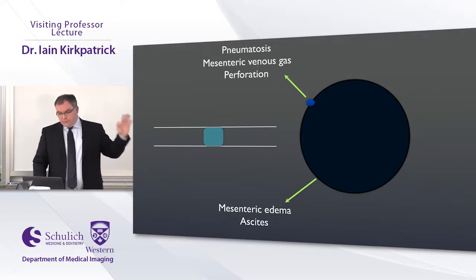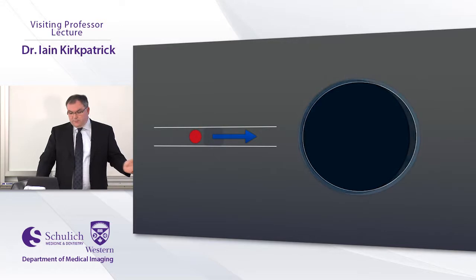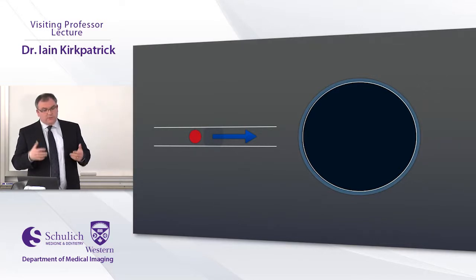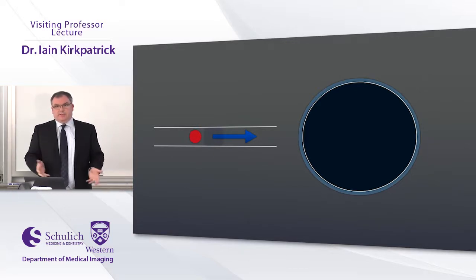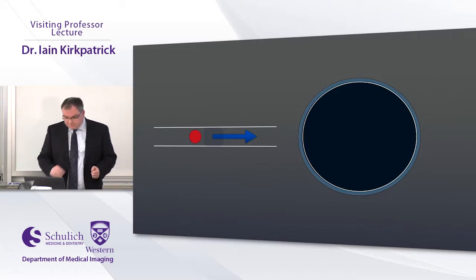Now, if we manage to reverse the inflow problem before gangrene sets in, then we enter what we call the reperfusion phase. So here, when you reperfuse the bowel, you see bowel wall thickening and hyperenhancement. And the reason for that is the ischemia incites an inflammatory reaction within the wall. So that makes sense. You've got hyperemia, you've got more iodine reaching there, and of course the edema is making the wall thicken up. And you'll notice that up until this point I haven't really talked about wall thickening, and that's because usually in inflow ischemia, wall thickening is not really a predominant finding, especially at the beginning. It's a late finding if it occurs at all.